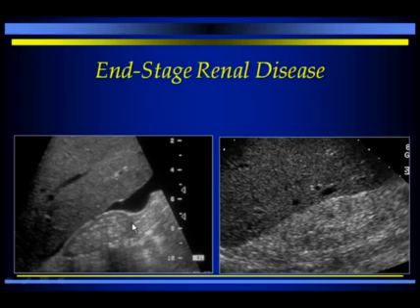As opposed to this case where the kidney is actually rather small. So here we have a small echogenic kidney, and look how thin the cortex is. We've got loss of parenchymal thickness, and this is starting to look like end-stage renal disease. And we see here some ascites, often associated with renal dysfunction and end-stage renal disease. And the slide on your right here is also end-stage renal disease, and what's actually happened is that the kidney is so echogenic that it begins to blend in with the perinephric fat, and we actually can't pick the kidney out that well. This is often seen in end-stage kidney.